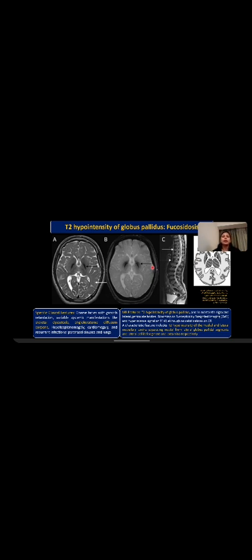So, till now, we have discussed the other pattern, which was hypomyelination with involvement of the basal ganglia. Now we saw many of the cases already in which there was presence of T2 hypointense thalami.